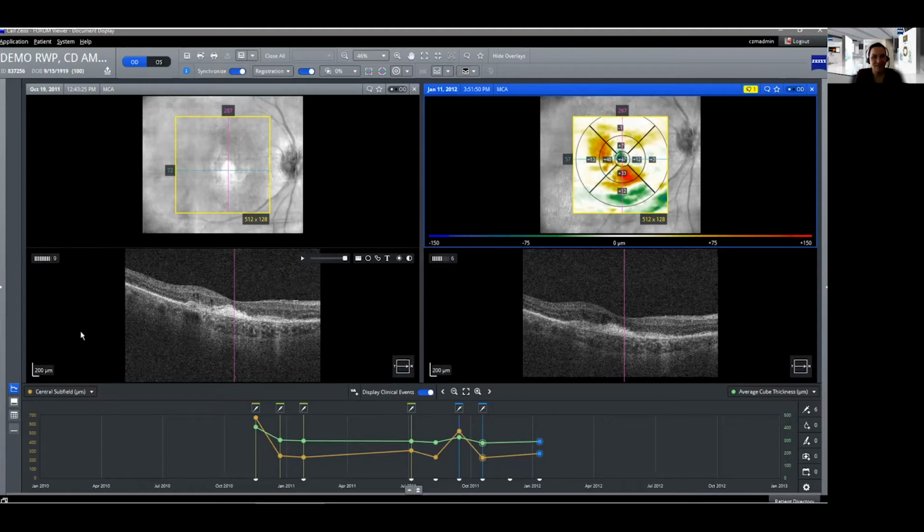I actually must note here that we're using Zoom for this session, and Zoom unfortunately compresses information, so you may not see as nice and easy to read quality as I do, and also image quality. That is unfortunate, but I do see a pretty nice image quality here, but you may not be able to see the numbers that are being shown here on this delta map, depending also on the size of your screen. But you see all these different numbers. I'll make this a little bigger.